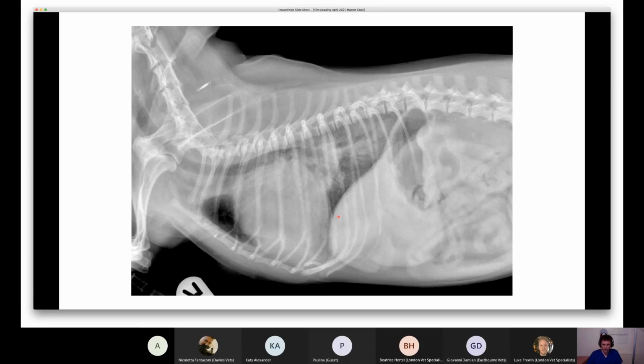That's true for dogs, not necessarily for cats. So cats with HCM, for example, when they go into failure, the distribution of the edema is much more erratic. So you don't tend to typically get hilar and dorsocaudal edema in cats with failure. It can be patchy and occur really anywhere and everywhere.